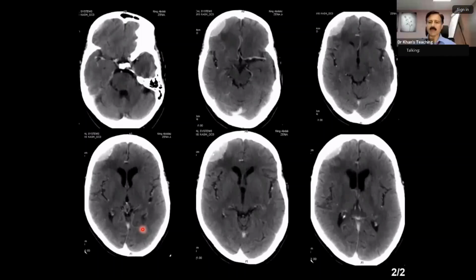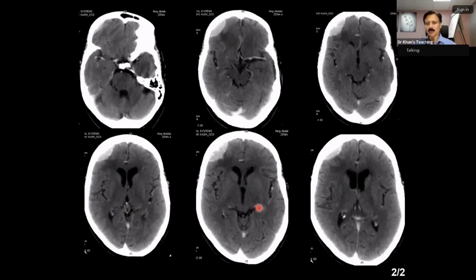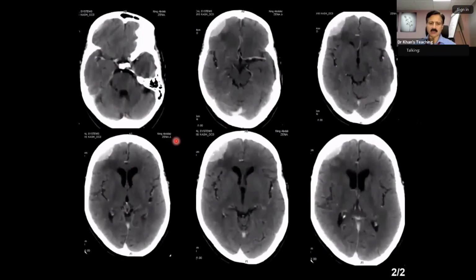Have you noticed that I've shown you maybe elliptical kind of meningioma? This is a meningioma. Yeah, that was a trick case, which can come in the exam. This is a classical trick case where you assume things. And by the way, this is what happened in this case. It presented with history of trauma. The key thing is that this is a meningioma with calcifications. You start thinking, why calcification? Give contrast. And this is a meningioma.